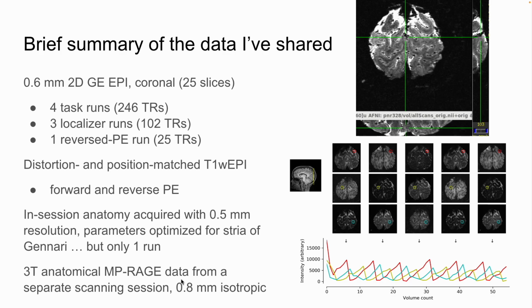If you're not at all familiar with this, then my brief explanation will not be everything you need. But in a nutshell, I've got 25 slices, and I've grabbed 3 of them to illustrate. Across the rows are 3 different slices, so you'll recognize 3 different shapes in the 3 different rows. And then across the columns are 5 different time points out of the 55 that I acquired, which was overkill.